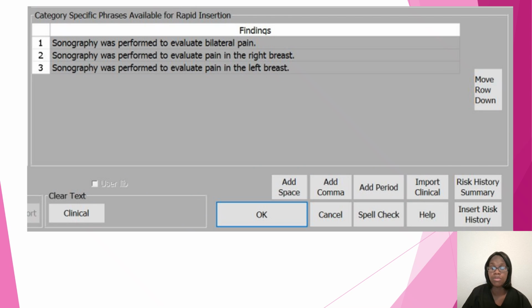So we have more information for breast ultrasound techs. Also put in the comment box, if you are a mammo tech watching this video, if you are a breast ultrasound tech watching it, or if you are a student that's watching this video and you're just trying to learn, get ahead in clinic because you're watching the techs and you don't know what they're doing, because that was me. The techs were clicking on things, but they wanted me to mainly focus on the patient care aspect of it instead of charting. So whenever ultrasound has to be done, the sonographers will put in or click the exam was performed due to bilateral pain or pain in the right breast or the left breast.